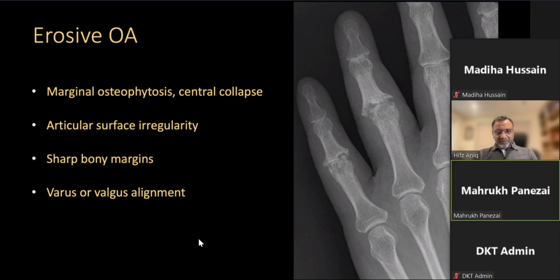One type of deformity is in sagittal alignment, which goes okay, it can be like that, or swan neck, where the neck goes the other way. In arthritis, it can be sideways, valgus or varus, on one side. Alignment in this case compared to the other.